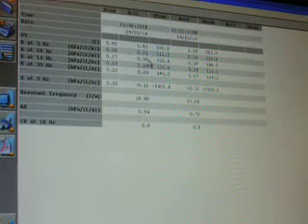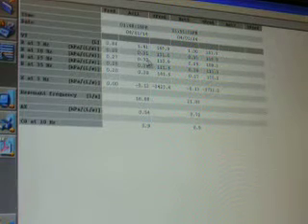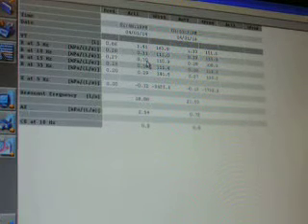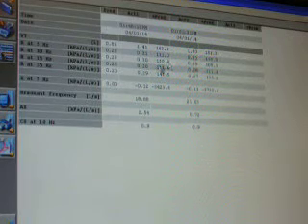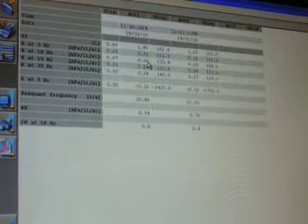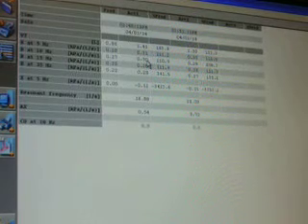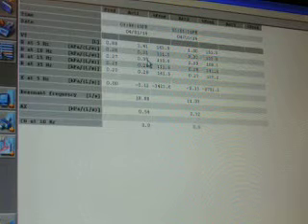With IOS, we just want 3 maneuvers that are acceptable, that have an R10 value that's within 20% of each other. So if you do 5 or 6, you can pick and choose which ones you want to use to see if you can get 3 that are within 20%. Once you have selected the 3 maneuvers that you want to report out, you have 3 acceptable and repeatable.